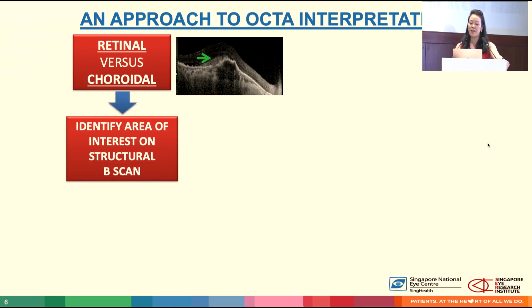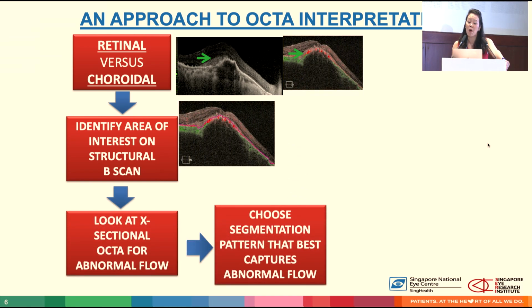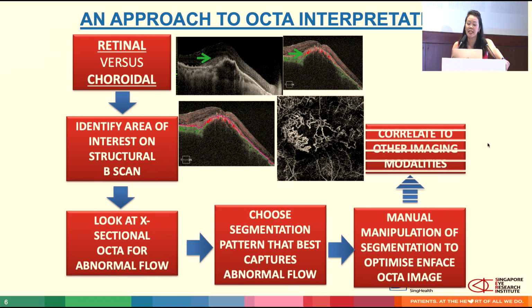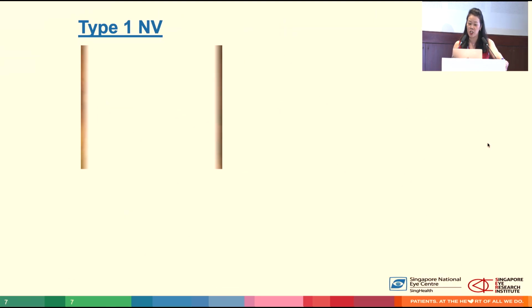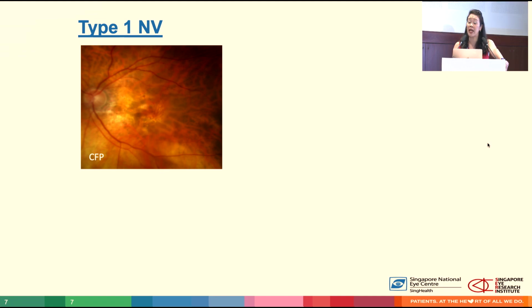Here I give you an overview of how I interpret OCTAs, especially if you're starting. This is a good overview on how you can look for the area of interest on OCTA, because OCTA as a technology is only useful if you are good at OCT and you are looking for the area of interest. Let's go into some of the AMD lesions.